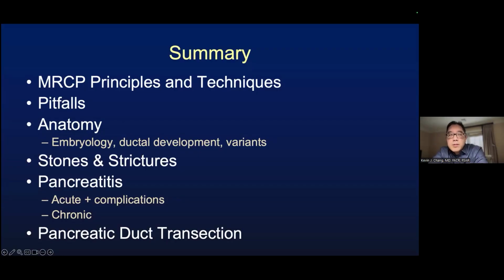I'm not sure if it's because there may not be significant pancreatic exocrine function left, but it's definitely a finding I will mention to our referrers. Whether it gets intervened upon or not is another question. But it's not typically something I see with a pancreatic mass. A pancreatic mass, if it's associated with ductal dilatation, should look more like extrinsic impression upon the duct.